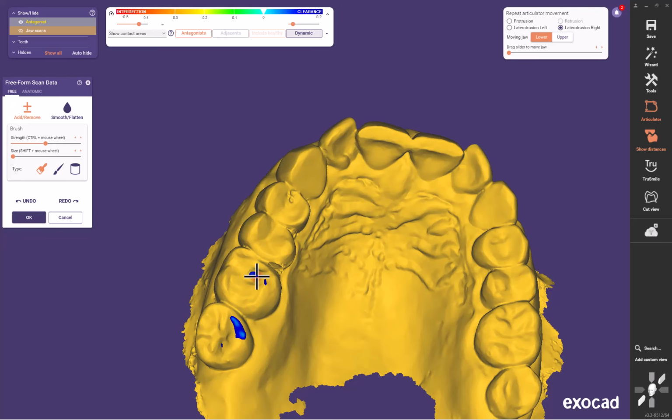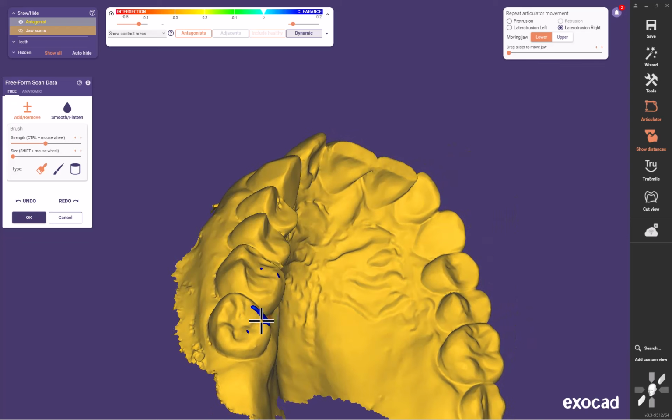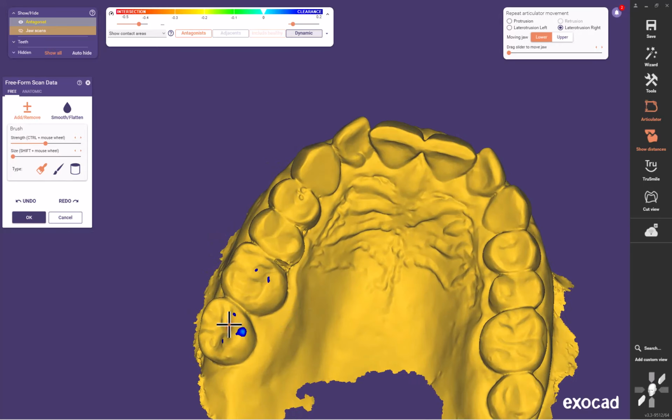Pretty much eliminate inclines. If it's on a good flat surface, I'll leave a remnant.